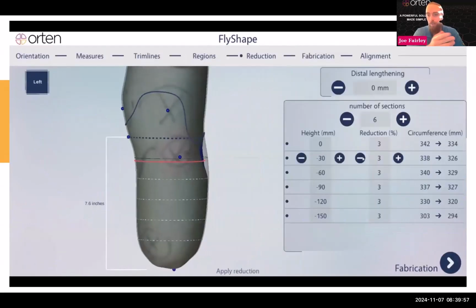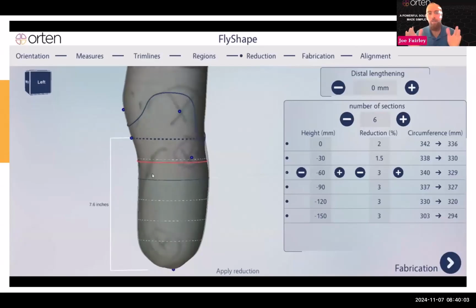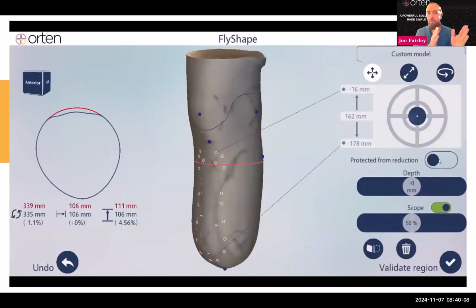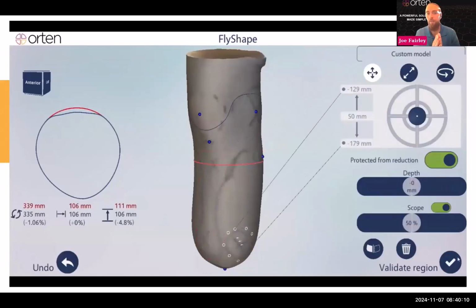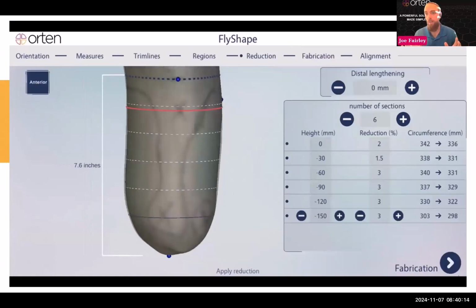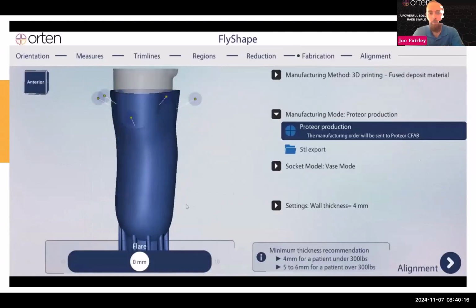We can also provide the global reductions by percentage. So we can see the grayed out version of what the limb looked like before and then what the limb looked like afterwards, and otherwise just have bony anatomy regions untouched completely during that approach.